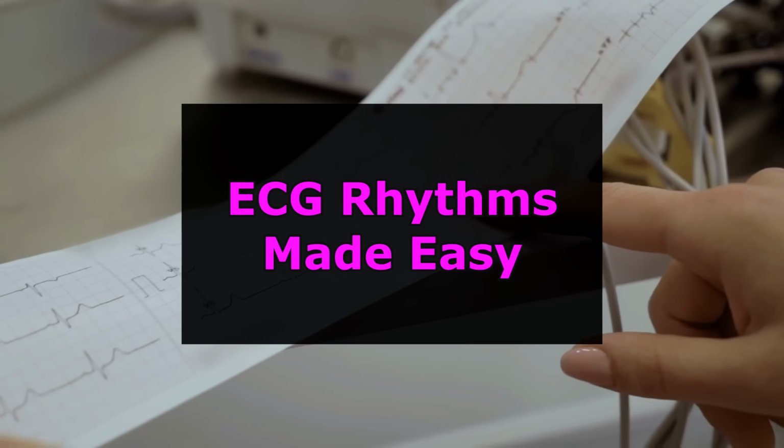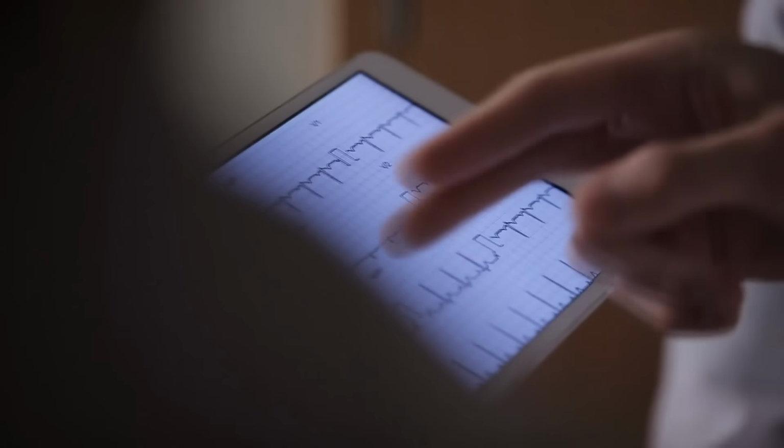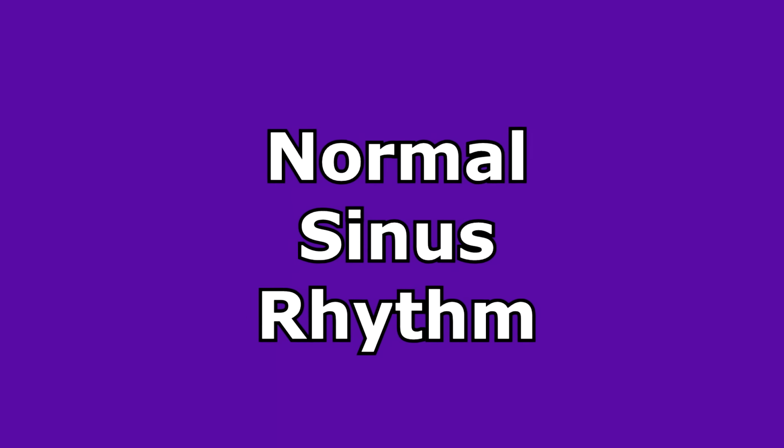ECG interpretation is an important skill that you want to have. And in this comprehensive video, I'll cover some of the most important rhythms you'll need to know in nursing. First, let's look at normal sinus rhythm.